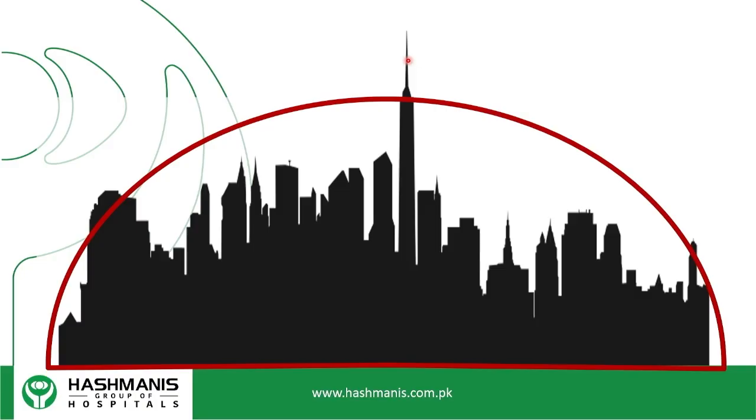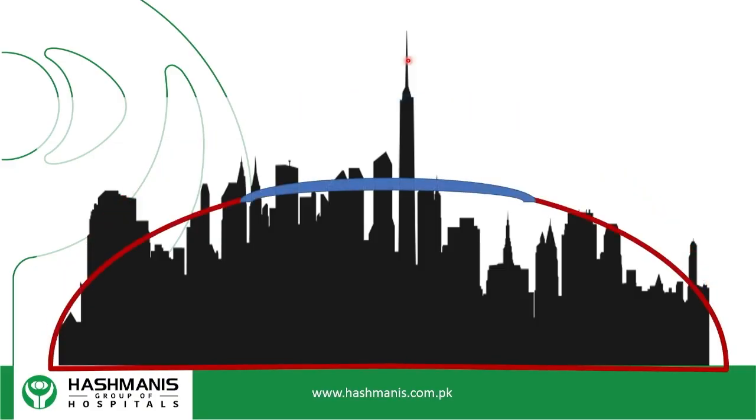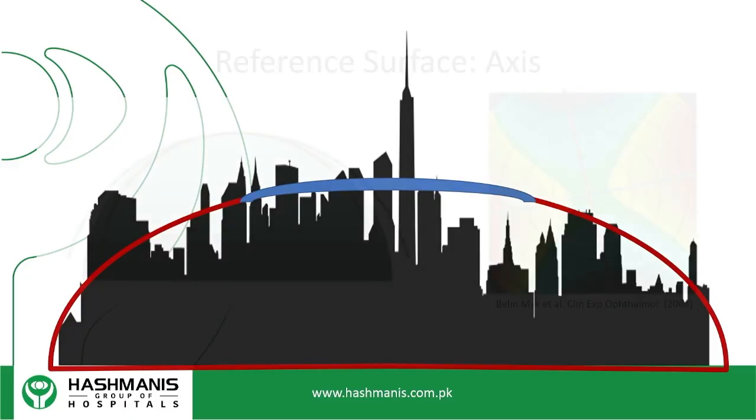So what then Belin and Ambrosio did was they created something called the enhanced best fit sphere. So within the center 3 millimeters, they take the data away and they extract it from the peripheral data to see where the best fit sphere was supposed to be. So what that ends up doing is it basically settles down, and you take that outlier data away where the cone is, and you basically put the best fit sphere down, and now the reference to the best fit sphere actually enhances itself, and that causes an exaggeration of the cone. And I'll show you practical data to show you how that differs.